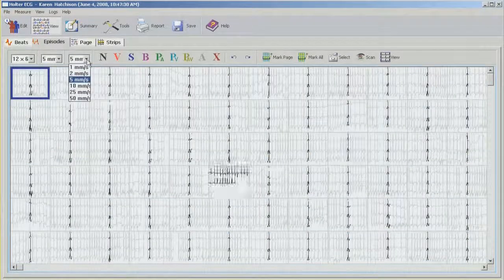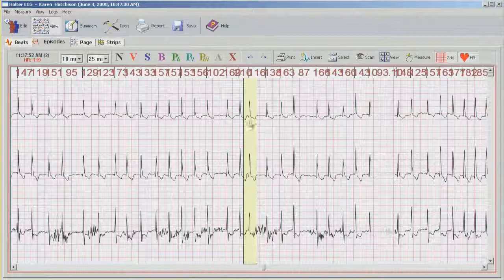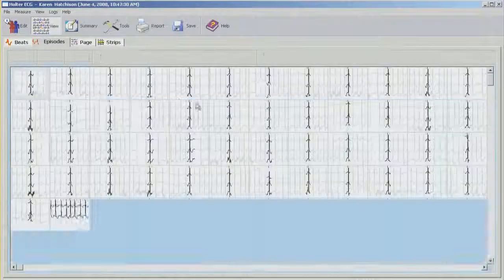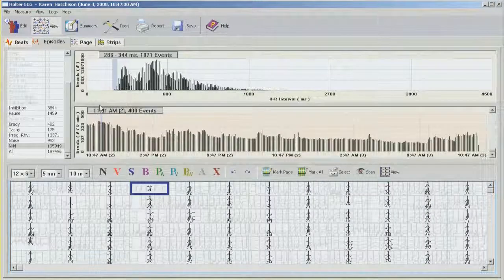Here I will change the speed again to 10, and this is our shortest NN, so just double click and select the label. Double click, tag any of the boxes, and use the Z button to go back to our previous screen. So at this point we're finished with all the editing.